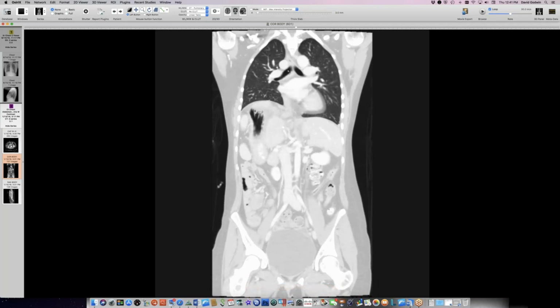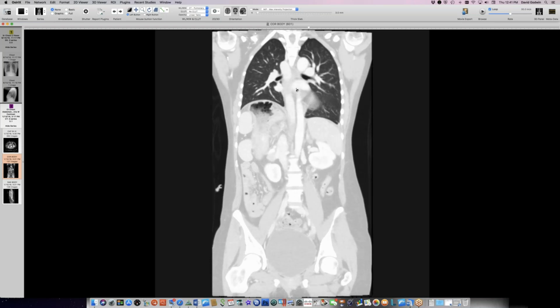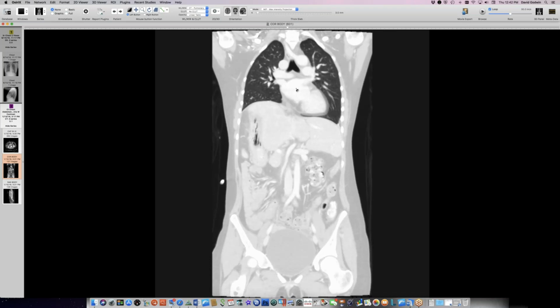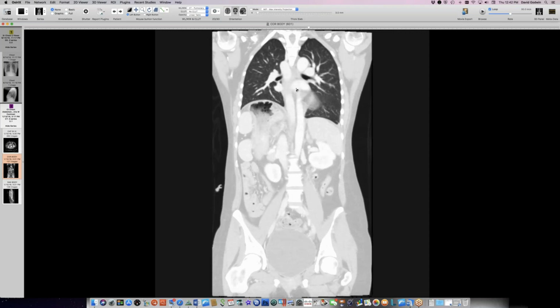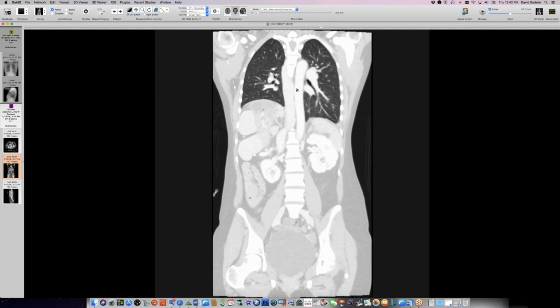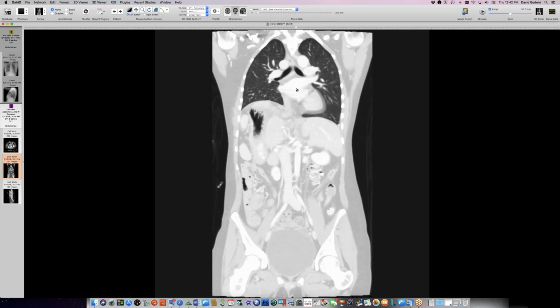So in this sense, it does imitate a left lung in terms of having a very long, unbranched bronchus. And yeah, that's right, it does. It has a prompt upper lobe, but it doesn't seem to have the usual pulmonary artery relationship with the bronchus that I've seen in other cases of left isomerism. But it's David, the pulmonary artery on the right. I'm sorry? The pulmonary artery on the right.